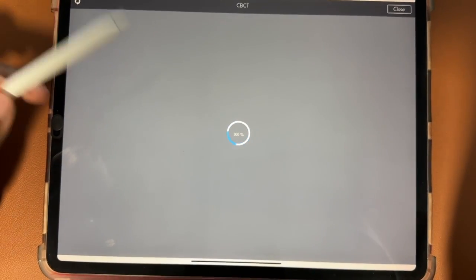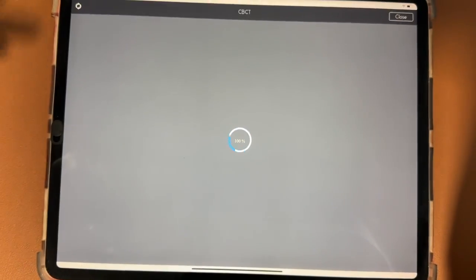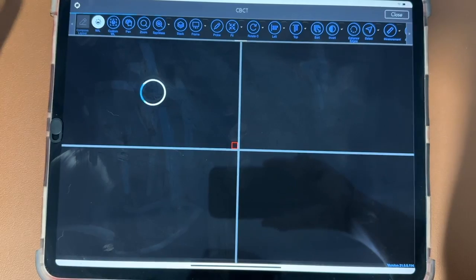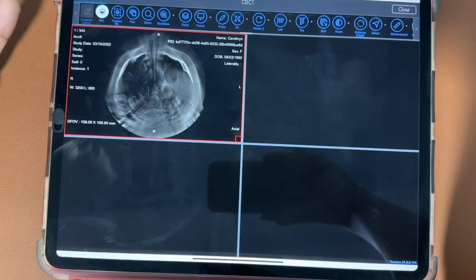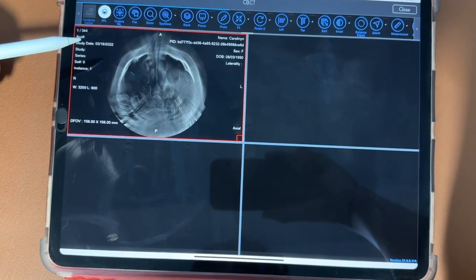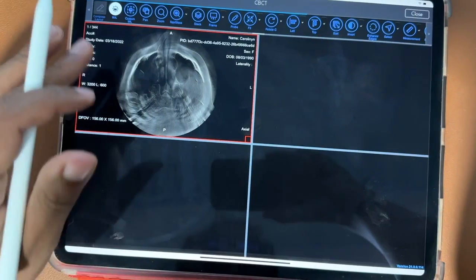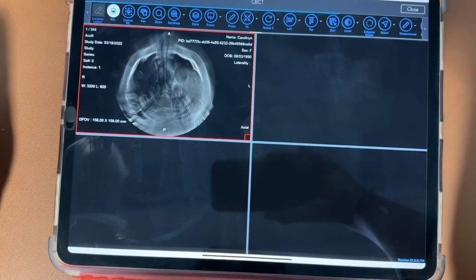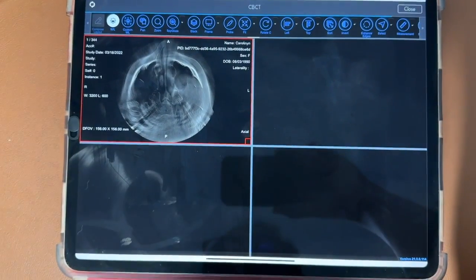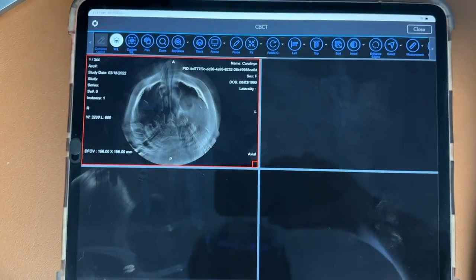By the way, when you upload the CBCT file into Smilefy, since it's a very heavy file, with over 200 megabytes, in general it would take maybe about 10 minutes for the first time after you upload it in here, and then after that it will always be, as you saw here, maybe a couple of seconds, okay? But the very first time will take a little while.